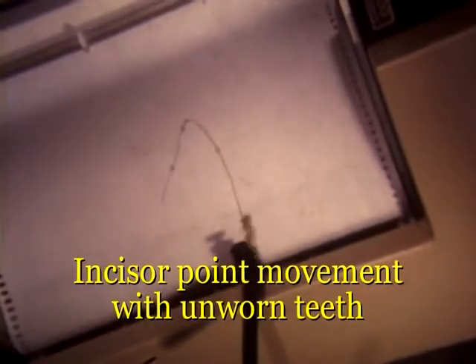The computer plotter shows the incisor point begins movement down the middle, moves wide lateral early in the closing stroke, and then coincides with the border path up to the intercuspal position. The computer draws a timing dot every 20th of a second, and then an arrow on the closing stroke. The arrow is also placed on the condylar and molar plots at the same time point.